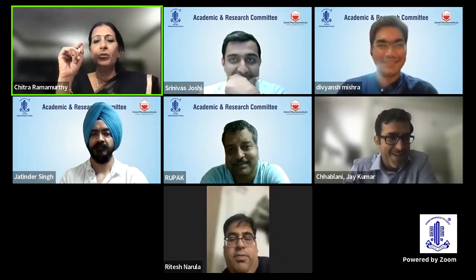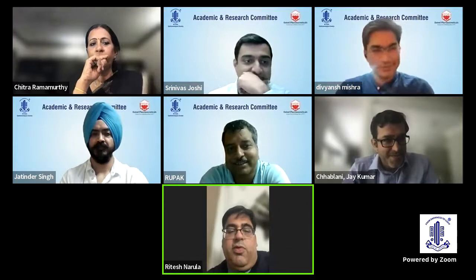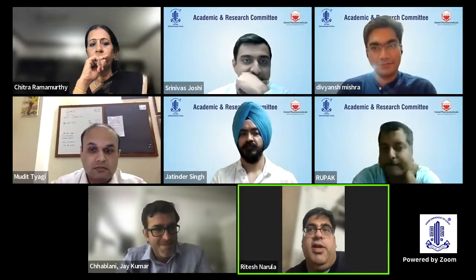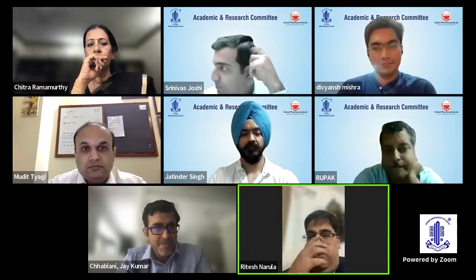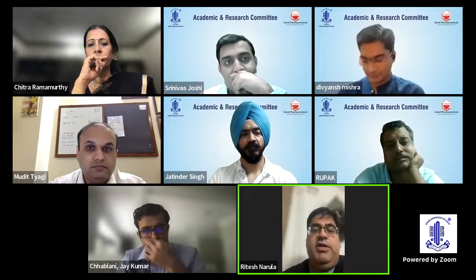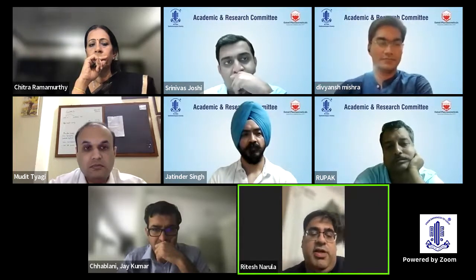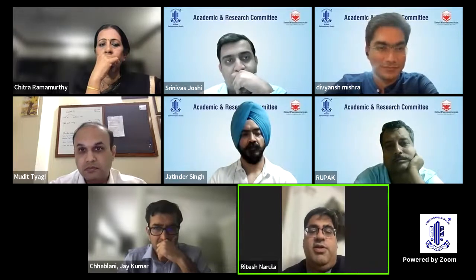Dr. Ritesh and Dr. Mudit, just one word from you all. Yeah. So, one quick comment, Jay very rightly said, most of the confusion happens when we are looking at choroidal neovascular complexes. In the newer machines, instead of looking at the normal choroidal cut, just take the RPE fit scan, and you will be able to pick up lesions much more quickly. You need not go through all the scans. That's just one small tip. You can try and pick up the RPE fit scan and just try and see that.